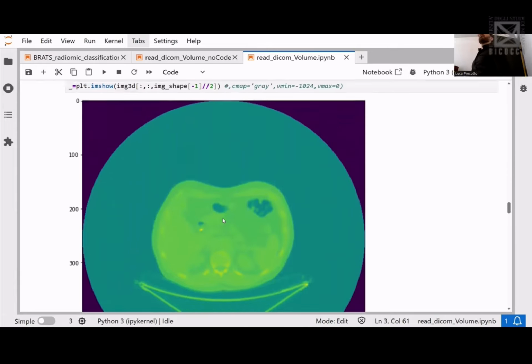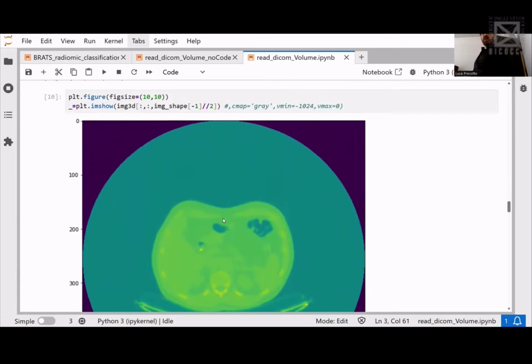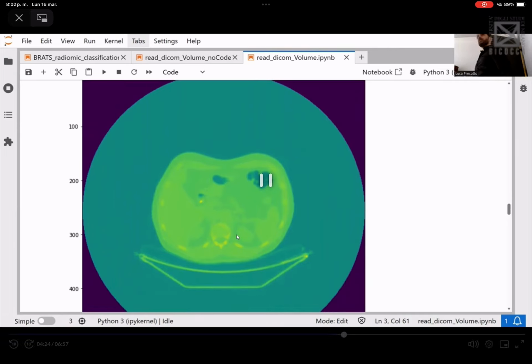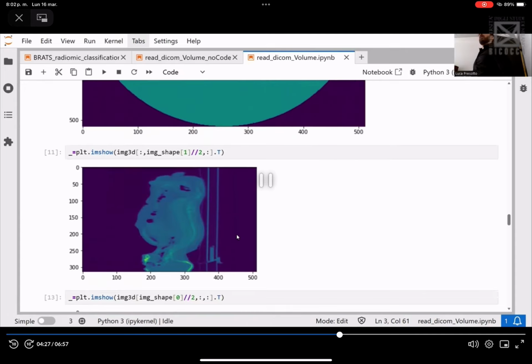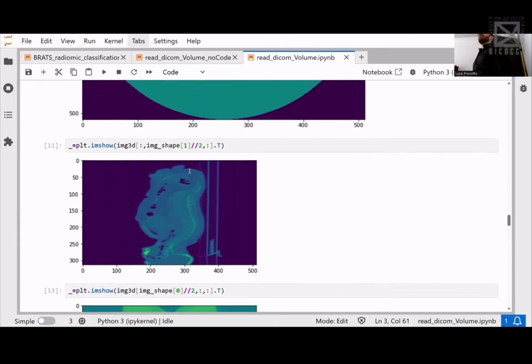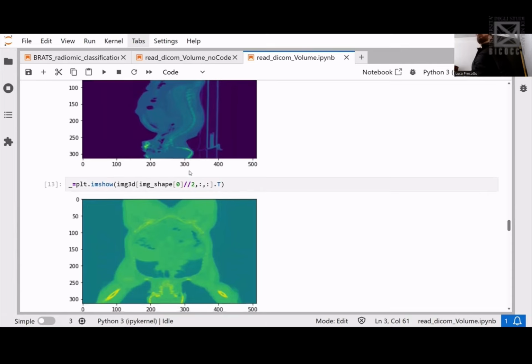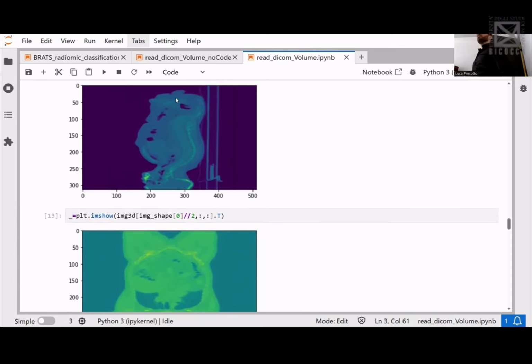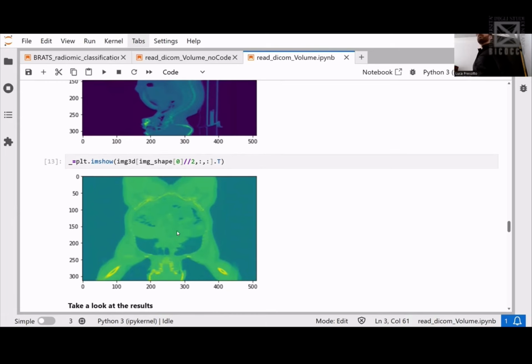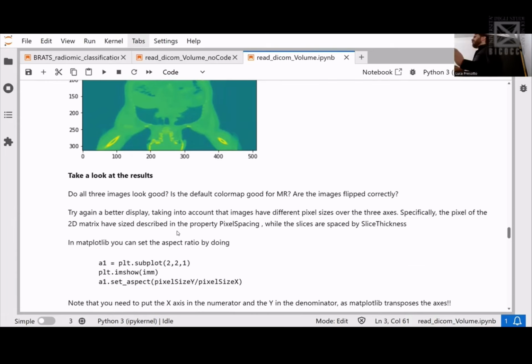And so again, what happens if you just display the central slice? You're just taking the central slice, and you get something like that. I'm displaying that in the 3 directions. On top of compressing all the intensity range, if you look at it, these 2 are also distorted. You see that they don't look too well. The thing is that the pixels in the XY plane have one physical dimension, while the slices are much thicker.